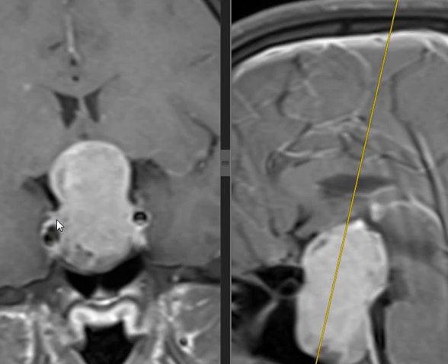And when the tumor gets big and starts causing mass effect and compression on the optic nerve and the cavernous sinus, then it will start producing symptoms and he will come to us. Why did it become a macroadenoma? Why did the patient let it increase to this size? Because it's asymptomatic. It's non-functional. Pituitary macroadenomas most commonly are non-functional, while microadenomas most commonly are functional.